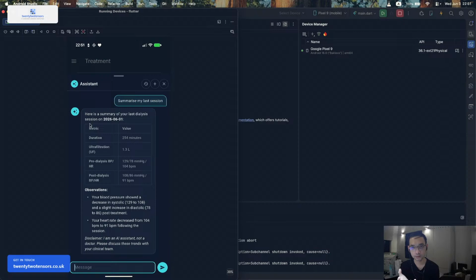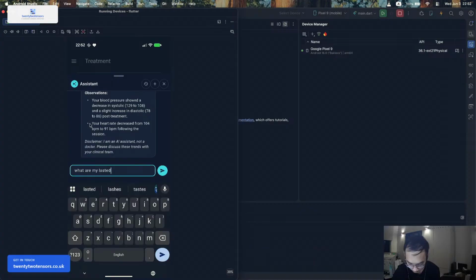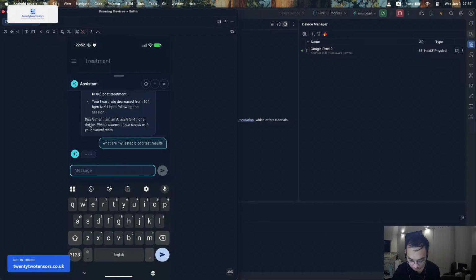And I can ask a question like, what are my latest test results? Yeah, it shows my latest blood test results.